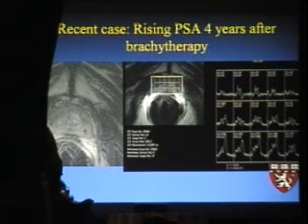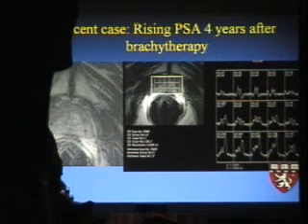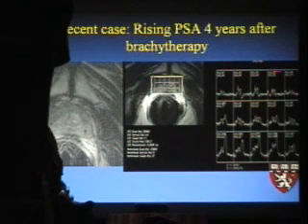And so we have a hard time finding that focal low signal lesion that we just spoke about. So here's a place where spectroscopy was extraordinarily helpful. And here's our grid. We put our boxes on. And over here, you may have only ever seen one abnormal spectra in your entire lives, because it's the slide I showed you 3 minutes ago, right? So look at these carefully and see if you can see anything abnormal.